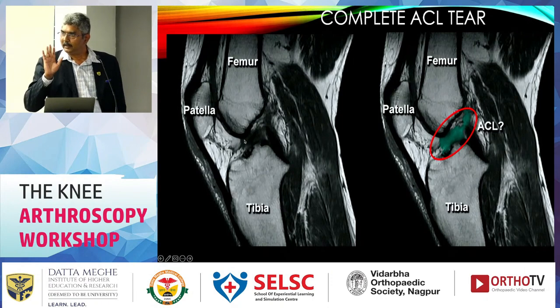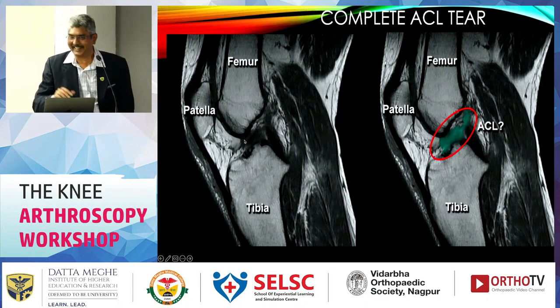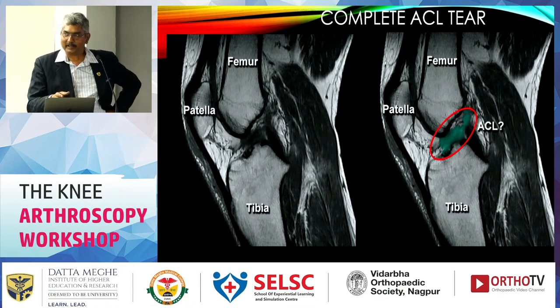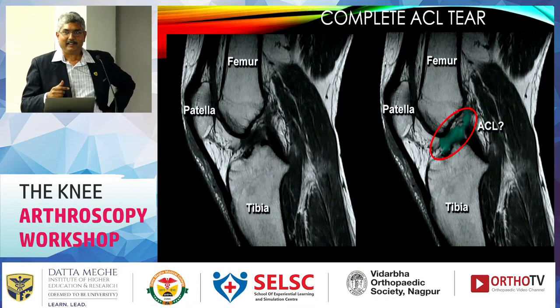Is the ACL gone? No, I became anxious, I feel anxious. Sorry. Whenever pathology comes, I become anxious. So here is the pathology. My wife is a pathologist. That's why I am a little more anxious. I shouldn't miss anything otherwise.